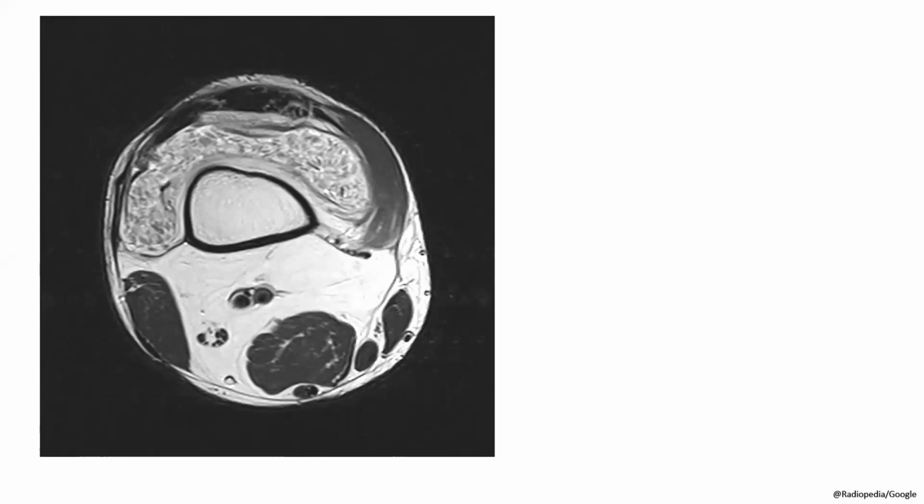What is this? This is MRI knee, just showing suprapatellar region, suprapatellar bursa, which is completely filled with multiple tiny, nodular lesions, which are completely filling this suprapatellar recess.